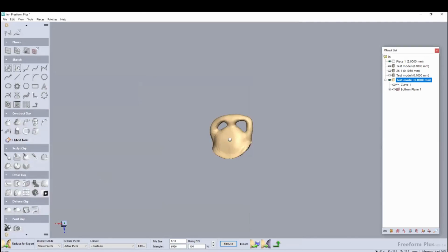So today I showed you basic functions, and I showed you how you can get a simple crown, and how you can get a crown with a more difficult task, for example for zirconia printing. So in the next course I will show you a more difficult task, and I will show you how we can create a mandibular implant with the mirror.